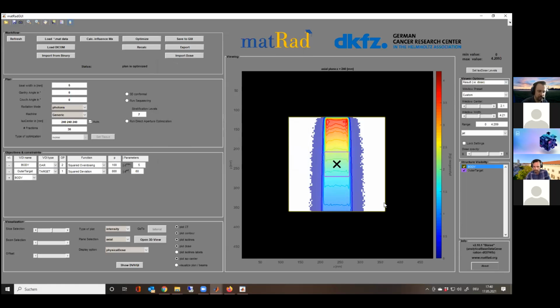So if you arrive at this step, then for you, everything works and you shouldn't have any major problems continuing. There might still be, you might click somewhere in the remaining process, in the next days, and something might fail, and then you will be sad and need to restart Matlab or something like this.